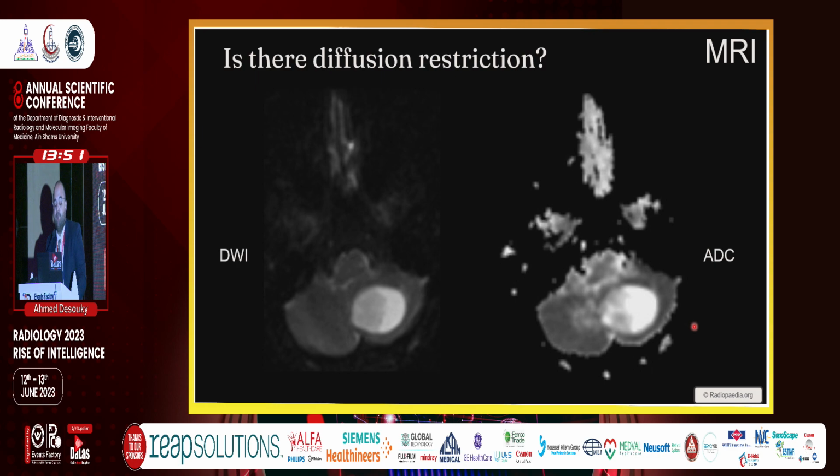All right. Is there any diffusion restriction in these images? Well, the answer is no. So there's no diffusion restriction, as Professor Shaimaa mentioned in her lecture, commenting about the diffusion restriction. So it's very important to look at it while assessing pediatric brain tumors.